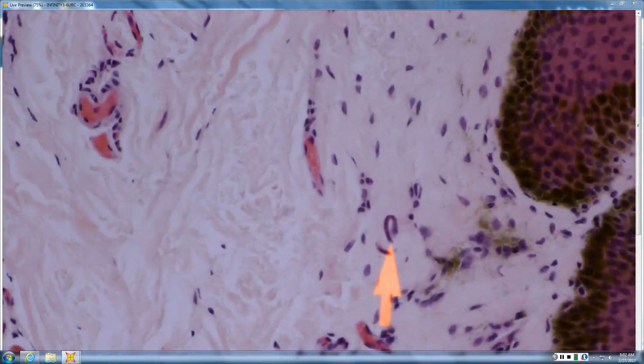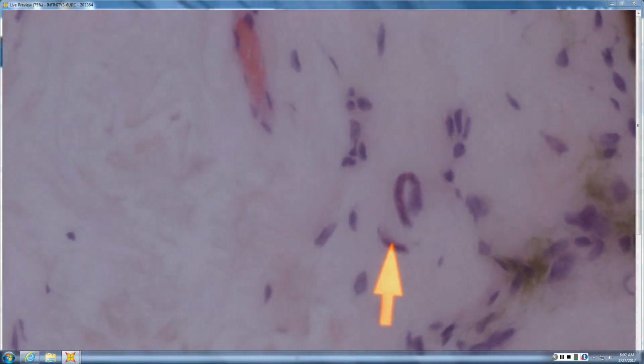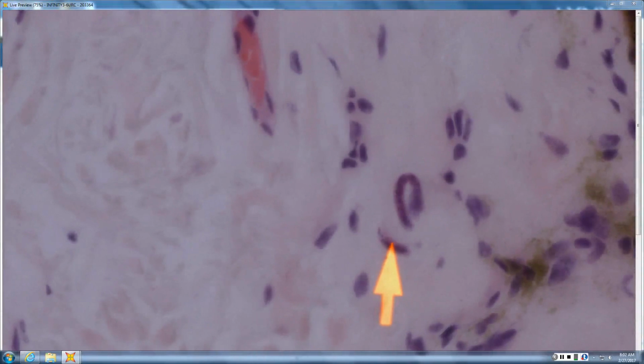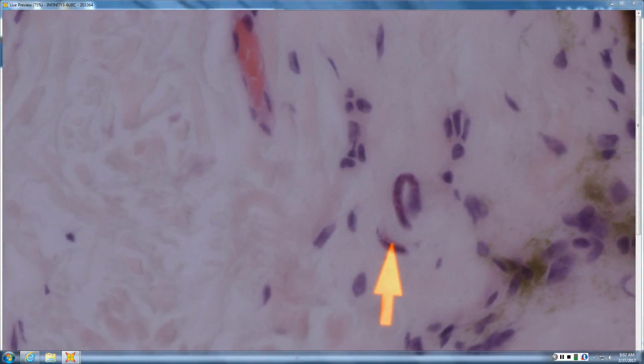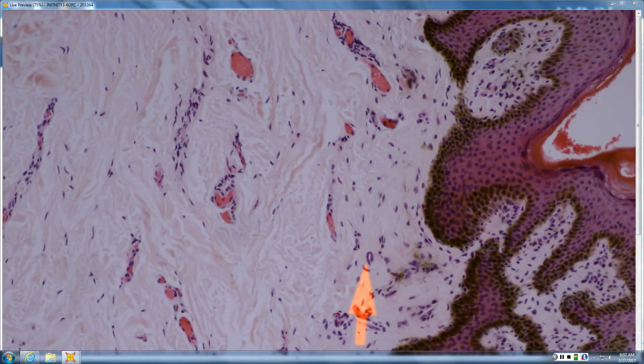So that little twist, what are we looking at probably? Microfilaria, exactly. Now you mentioned filariasis. Do you think this is filariasis? What would be the difference between a filarial worm and a microfilarial worm? Size. Size, you got it! This is about 1/100th the size of what a filarial worm would look like.